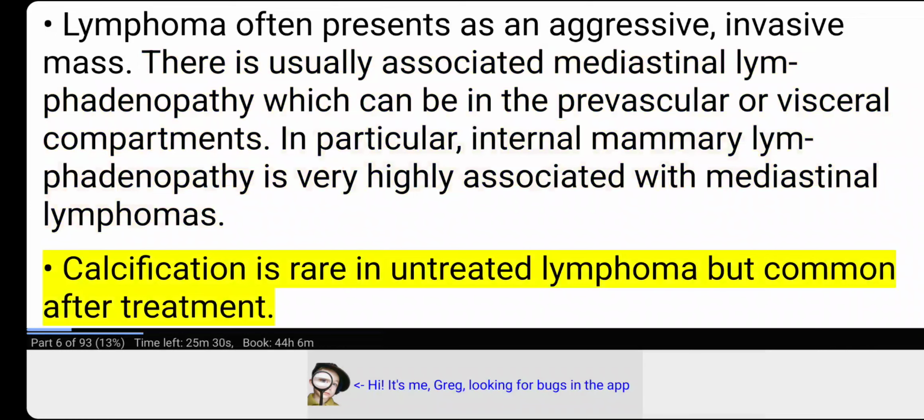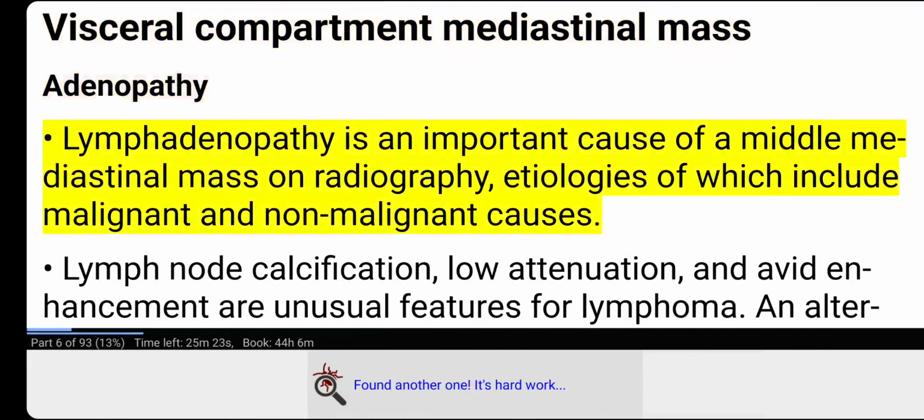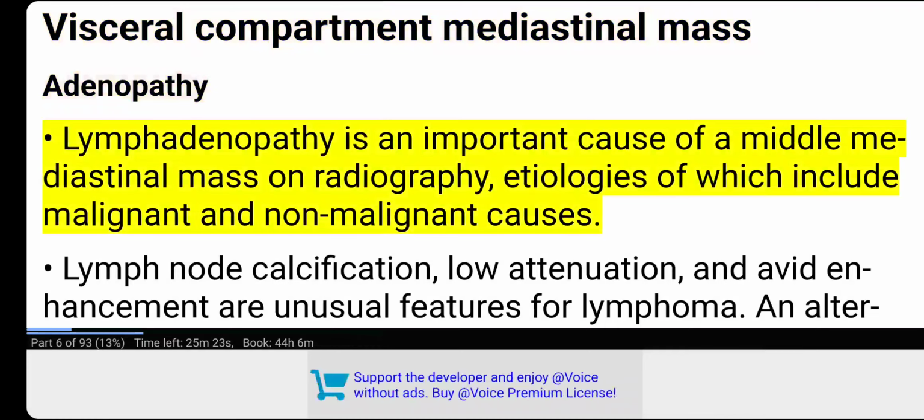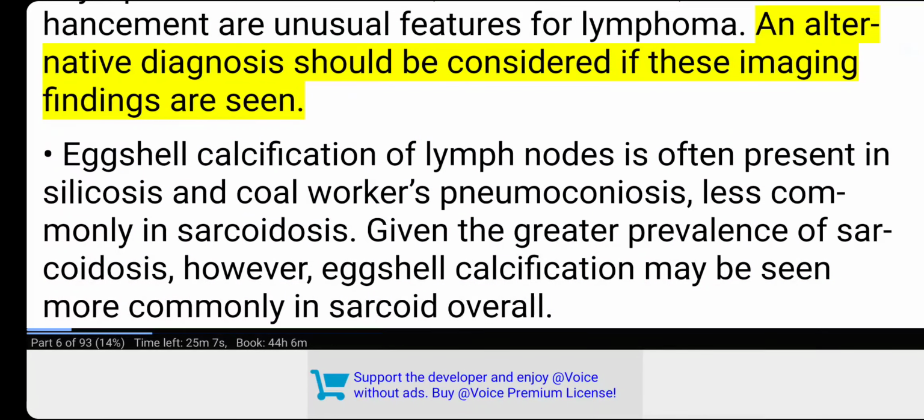Calcification is rare in untreated lymphoma but common after treatment. Visceral compartment mediastinal mass. Adenopathy. Lymphadenopathy is an important cause of a middle mediastinal mass on radiography, etiologies of which include malignant and non-malignant causes. Lymph node calcification, low attenuation, and avid enhancement are unusual features for lymphoma. An alternative diagnosis should be considered if these imaging findings are seen.